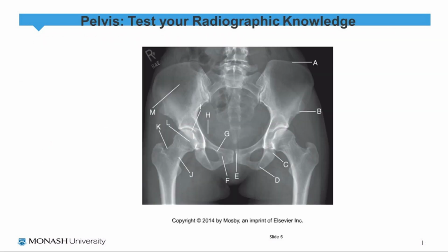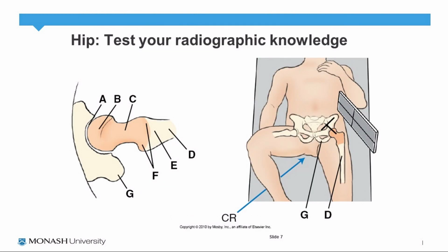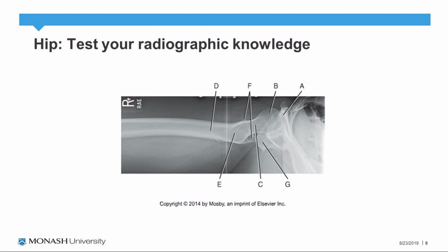I've also included some radiographic images to test your radiographic anatomy, so I would encourage you to complete this. I will give feedback on all of the radiographic anatomy labels when I give feedback on the practice bank. And here I've included a lateral hip view with the radiographic X-ray image to test your knowledge.